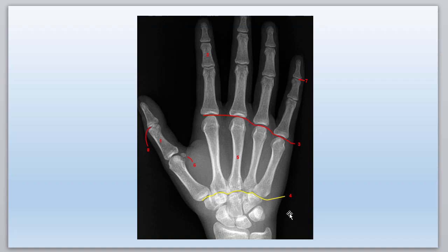And we'll go, I think I got a better one to go through. So let's just look at these lines though. So these are the carpal bones. This is the distal row of carpals here, proximal row of carpals here. These spaces between are intracarpal joints. And now we have this. So this is the carpometacarpal joints. This yellow line, number 4. Carpometacarpal joints. Let's go through the numbers.